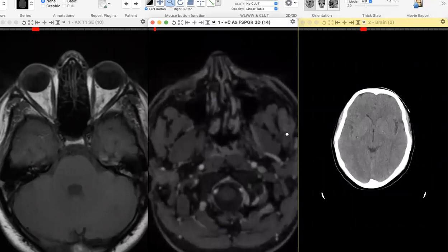the diagnosis becomes almost certain for neurocysticercosis. You said multiple sclerosis. I wouldn't put multiple sclerosis in the differential. The differential would be neurocysticercosis, tuberculomas, maybe toxoplasmosis.